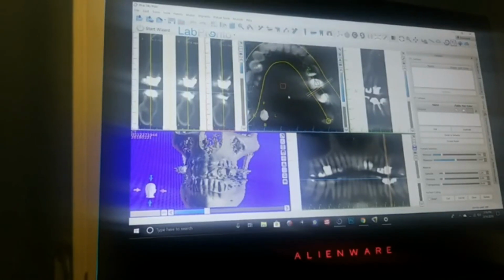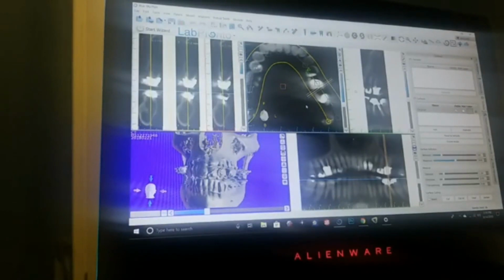One, in order for me to know exactly when I'm looking at my CT scan on this program, how do I know where exactly in this jaw, maxilla, mandible, left, right, what tooth number, what bone, which area is this right now at this point, this image that you're looking at right now, what area is it pointing out to you? Because you have some teeth over here. So which teeth are these? Is it 19? Is it 20? Is it 15? Is it 14? What teeth number are you looking at in this area?